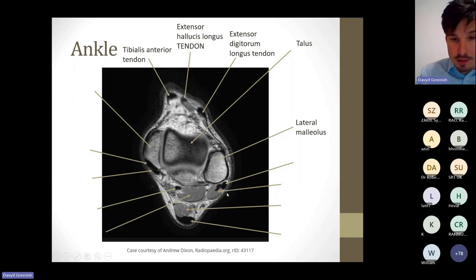I would say that this one, to be fair, is maybe a slightly dubious area, but if we say it's pointed to the grade, then this is pointed to the muscle here. So the peroneus longus basically sits slightly lateral and then scoops underneath the peroneus brevis tendon as we come more inferiorly. This here, right at the back, is the Achilles.